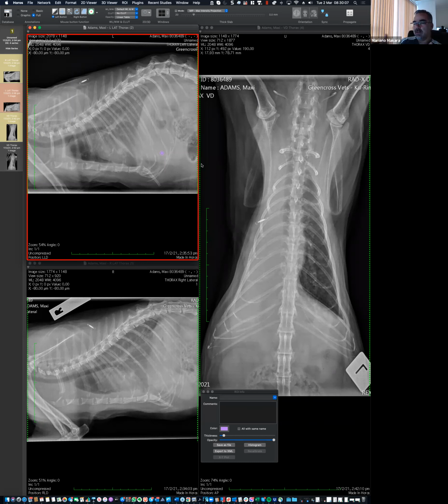That's a wet lung, and it's so wet that now we don't have air in the airway. Okay, that is still the disease process, just fluid within that lung. So I completely agree, and your thinking process is perfect 99% of the time where we want air bronchograms. But remember that it's not a necessary feature. It's an almost-there feature, but it's not a necessary feature.